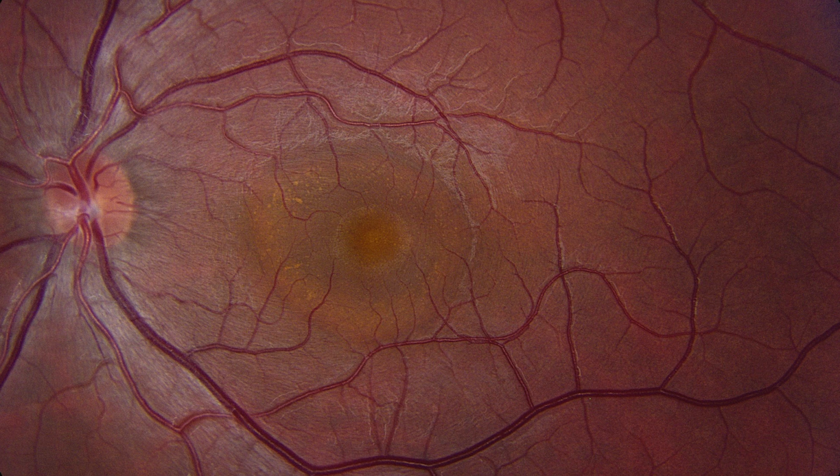This is that typical appearance, somebody with acute central serous chorioretinopathy with the subretinal fluid. You can see that well-circumscribed curvilinear change in coloration that's consistent with subretinal fluid. That can also sometimes look like a PED, so you have to be careful. And then you see the yellow, tiny punctate subretinal precipitates.